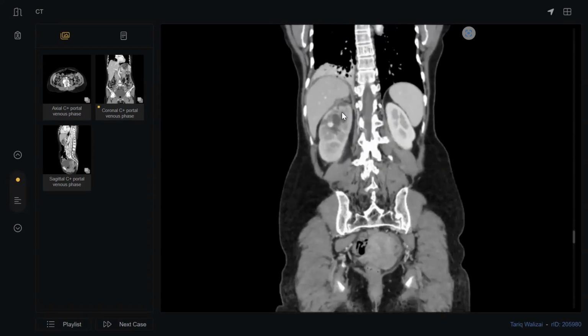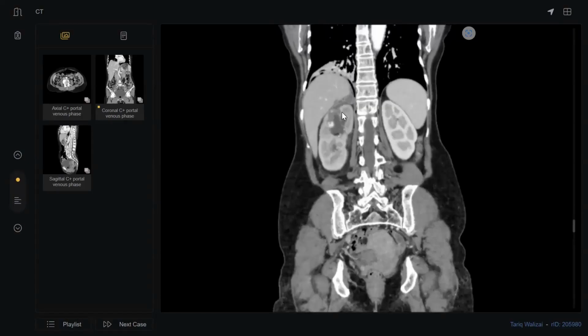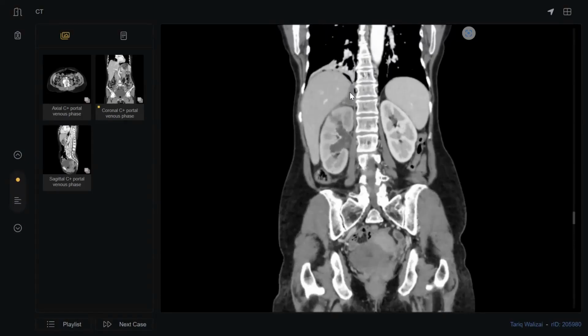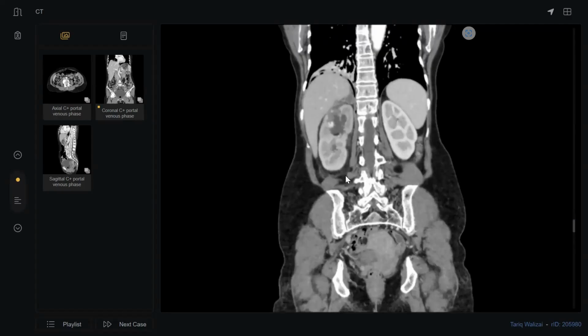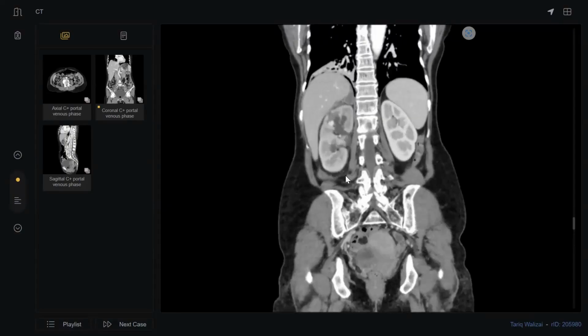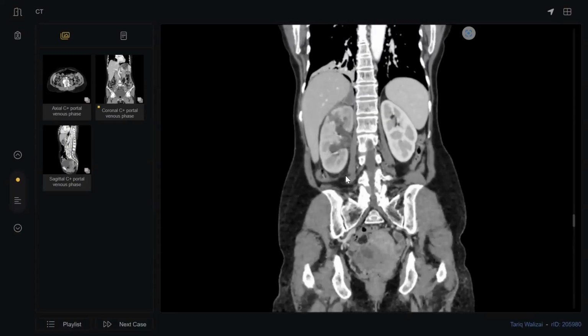Any other known malignancy is there, because involvement of the adrenal also. See, there is a pathology here and a localized pathology here. And you said there is almost a hematoma in the bladder. What is the scenario of this case? What happened, so that all of these circumstances occur?